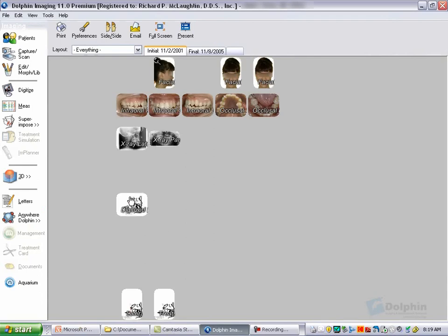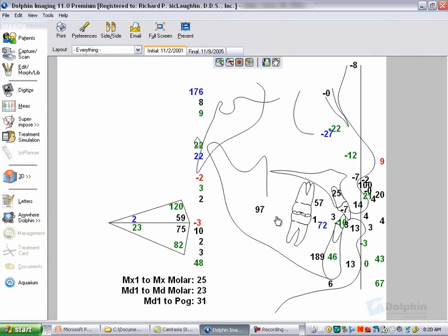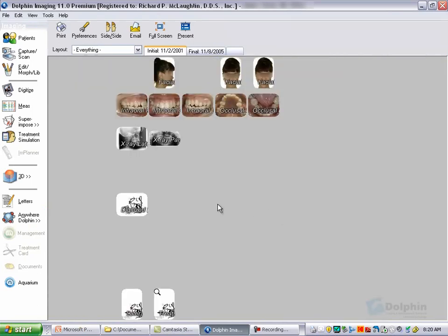And here you see recorded her digitized lateral ceph. You see a lateral tracing overlay, which can be done to place her face into the cephalometric X-ray, and then again our treatment planning x-ray. So once we've completed this information, we can now move to the surgical VTO.